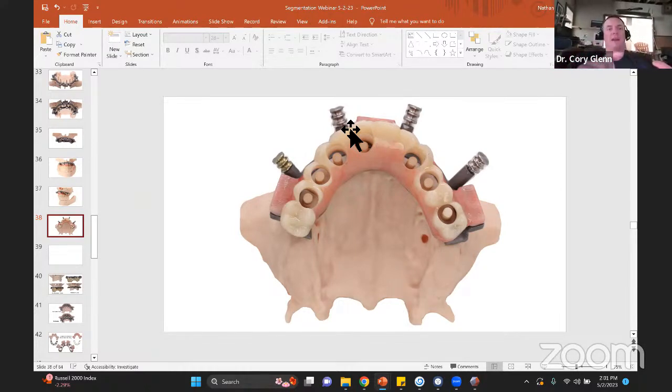So that's one thing I will say about a CT generated facial scan, we'll call it. Like what I was just talking about, take a large field of view, just adjust the density until skin shows up. The thing about that is it's already stitched in place.